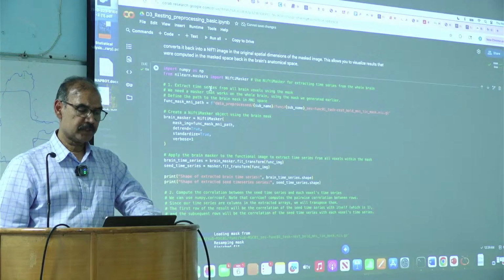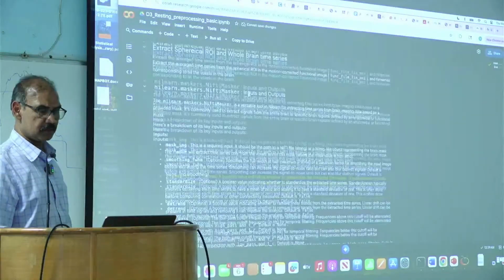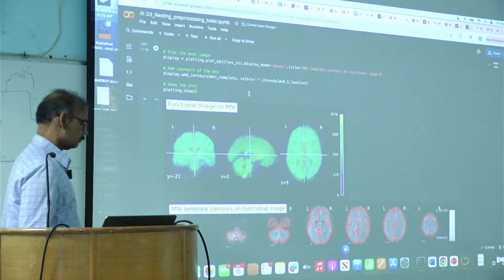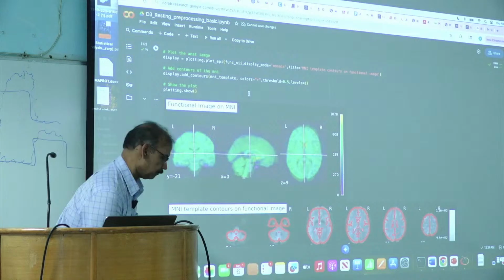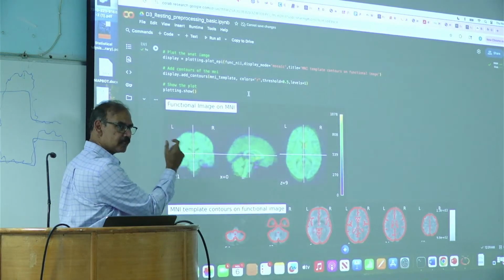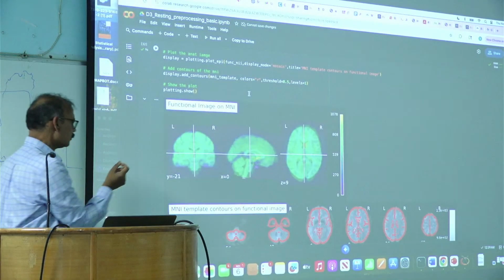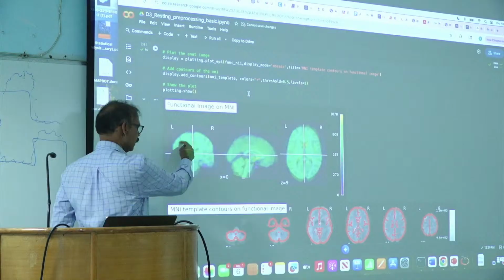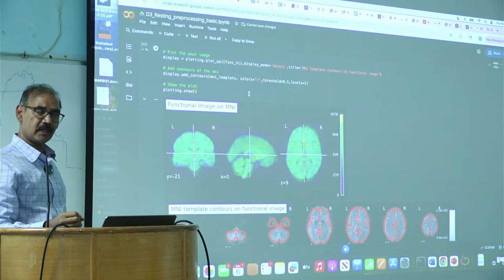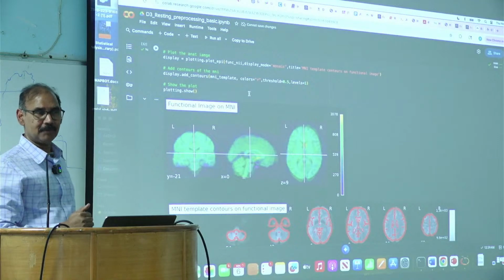So you're extracting from all brain voxels using the mask, right? So if this is the brain, what it will do is it will create a mask based on the coordinates and the radius that you give. And then based on this, it will generate a time series for the entire data set. Okay? Is that not clear?